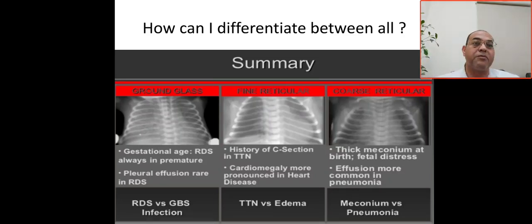I cannot comment about the X-ray, I cannot see anything actually. It looks like frosted glass. I cannot comment about the X-ray because of diffuse haziness, diffuse opacities, densities. Why? Because in the ground glass appearance, the air space is partially or completely atelectatic, or replaced with transudate or exudate.